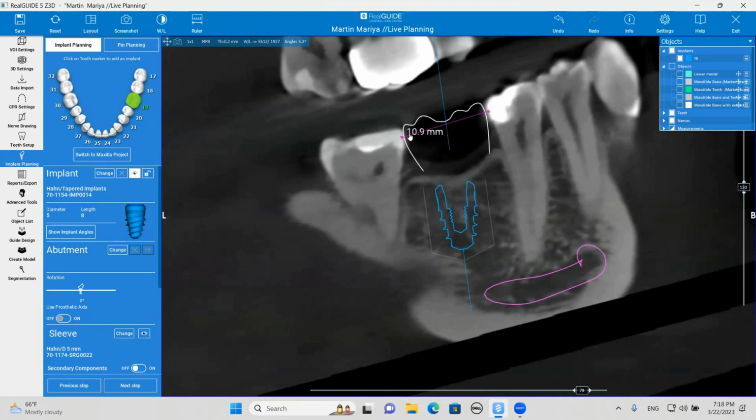That's 10.9 mesial distal; it's usually between 10.5 and 11. So that space is perfect for the 5x8. Do a tooth-supported surgical guide, and I think you'll be fine using some autograft and allograft on that facial aspect and building out the ridge a little bit.